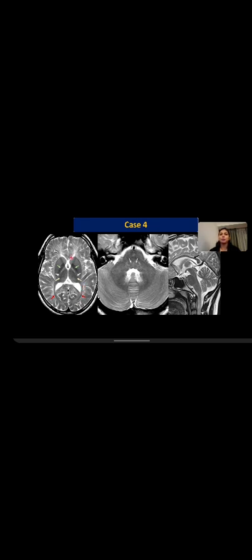So this is not HEMS because we are seeing diffuse hypomyelination, not only the posterior brainstem involvement, but we are seeing diffuse involvement, but there is sparing of certain structures. HEMS rather involves only the early myelinating structures. Maybe seeing the dorsal brainstem, you thought of that. But what else can it be? There is sparing of this structure, which is the optic radiation. So there is also sparing of the pyramidal tract of the internal capsule. Apart from that, there is sparing of the medial lemniscus. And there is associated globus pallidus hypointensity, hypointense thalami, and there is corpus callosal atrophy.